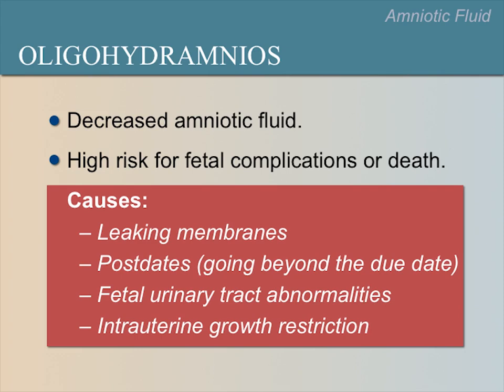another lecture. If the membranes are leaking and the leaking has stopped, the membranes may reseal and the amniotic fluid levels could return to normal. Patients with leaking membranes are at increased risk for infection. With oligohydramnios, you will see little or no amniotic fluid on ultrasound. The fetus will appear crowded. Because of the lack of fluid, the fetal parts are more difficult to see clearly. This will be easier to understand after more hands-on scanning.